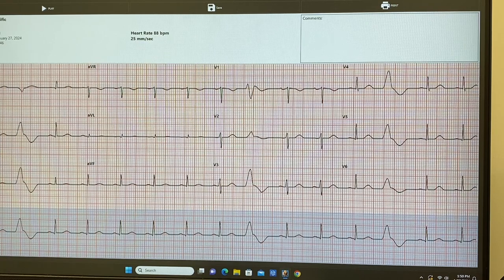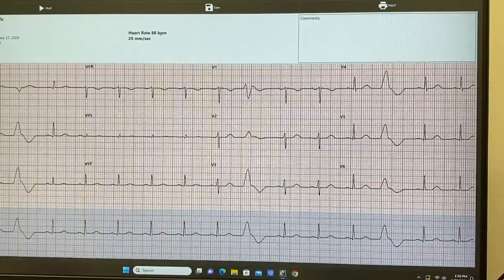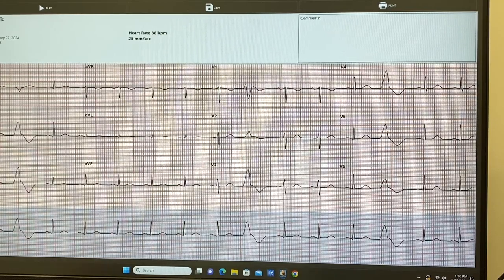The name of the rhythm, not the description, the name of the EKG, like tachycardia, the name of the arrhythmia or dysrhythmia. If the PVCs weren't there, what is the underlying name? Oh, normal sinus rhythm. There you go. So we call that the rhythm. I know it's confusing.